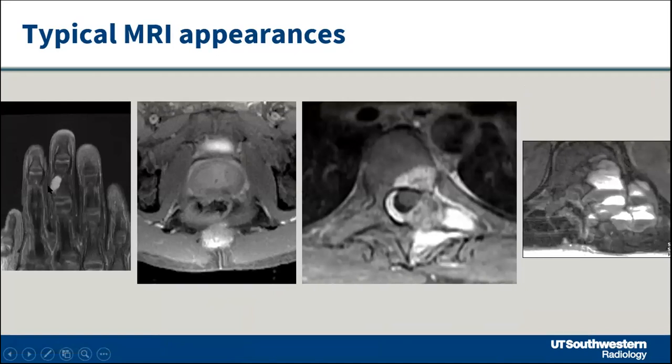Even this one now, here, in the fingers, you get enchondroma, or chordoma in the tailbone, or osteoblastoma. More than 1.5 cm is osteoblastoma, less than 1.5 is osteoid osteoma. So anything in the pedicle, you're looking for osteoblastoma or fluid levels of ABC with these artifacts caused by the fluid level. So these are easy.